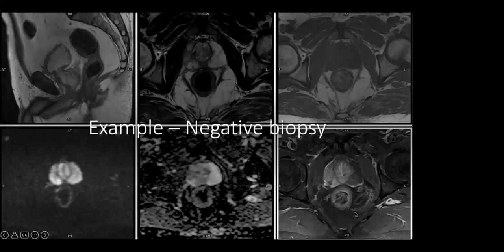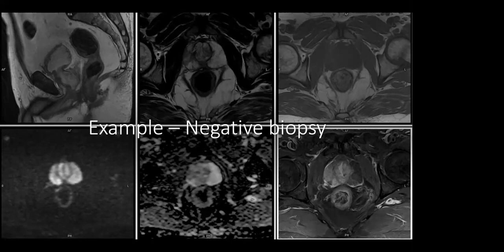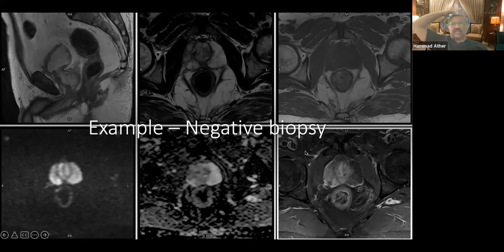If it is subtly hypointense or has no hypointensity, then it is less likely to be a cancerous lesion. So, some examples of negative biopsies. I think we have discussed all those points which can make it a negative biopsy. And I think you have very clearly mentioned the characteristics of a BPH nodule versus tumors in the peripheral zone and prostatitis, which can be a real confusion in clinical scenarios.